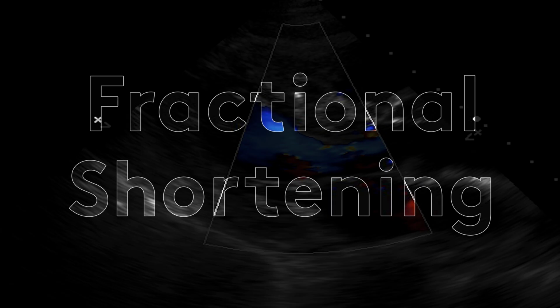So if you remember last time, one of the critiques of EPSS is it's a correlative measure, but it's not directly measuring ventricular function, meaning you're measuring the excursion of a valve, which is highly dependent on blood flow through the valve or around the valve, in the case of regurgitant flow out of the aorta.